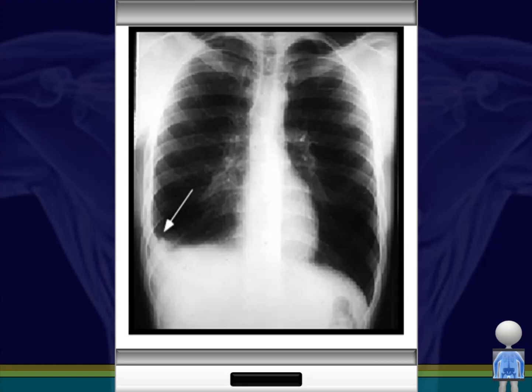Let's move on now to pleural effusion. Pleural effusion, remember, is not inside the lung, it's under the lung. So this is fluid that occurs under the lung between the diaphragm and the bottom of the lung. So pleural effusion is a dependent disorder. The fluid will find its way down to the bottom and therefore sit on top of the diaphragm and under the lung.